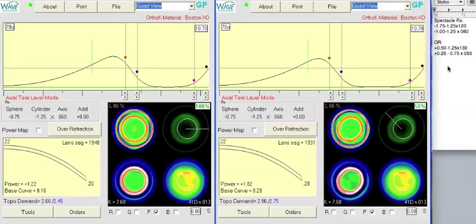Now this is the left eye, and we see that we have 3/4 of a diopter residual cylinder. So what we want is about 0.75 diopters more power in this meridian. It's going to flatten the cornea by approximately that much, and hence in this meridian it'll be 0.75 diopters steeper with induced toricity. So if I go to the original lens, we see in this meridian we initially have 1.2 diopters of power. An additional 0.75 would put us about 1.95.